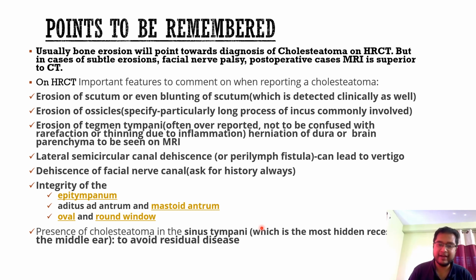within the sinus tympani. Why? Because it is actually blind to the operating surgeon. He'll go through the facial recess and he will not be able to see in the sinus tympani because of the pyramidal eminence. So if you actually give that in the report that the sinus tympani is involved, then he will go into the sinus tympani to get that residual cholesteatoma out. Otherwise, he will just miss it. So this particular entity can only be seen by radiologists and hence has to be reported.